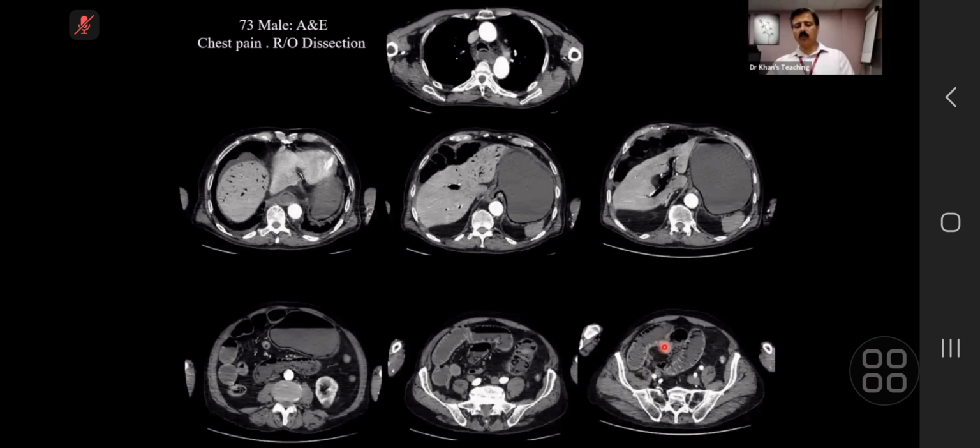Regarding ischemia, what should be your pertinent negative and positive? I'm not showing you everything here. This patient had obstruction. And with that, you can see the string of beads or string of pearls sign. And because of that, the gas, the same hypothesis, has gone into the wall, actually has also gone into the wall of the stomach.